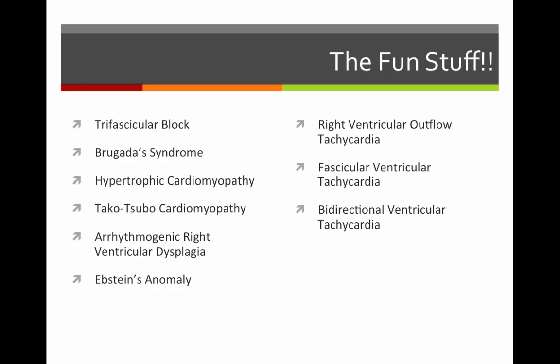So we'll talk about it just briefly, and then we'll talk about things that you should be activating the cath lab for when you see Wellens syndrome or De Winter's T waves. These don't have ST segment elevation, but when you see them, you should be activating the cath lab immediately, because if you don't, your patient will die. Just have a bad day.